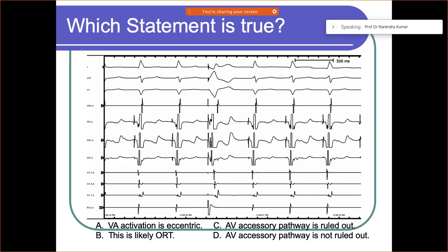So what is happening? Over here, now see, I'm trying to give you more hints so that you should try to recognize those hints. And in the end, we will come back again to these questions and try to conclude after the theory portion is over. You all are going to get a quiz session as well at the end, in which we will try to discuss each and every answer in detail, in fact.